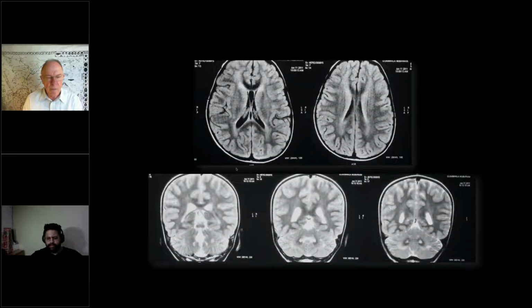So at this stage, I'll probably take over with the MRI findings. And we have the FLAIR images on top. The axial FLAIR images again demonstrate these periventricular hyperintensities with relative sparing of the subcortical regions. And on the coronal T2s in the posterior fossa, again, you can appreciate the similar posterior fossa findings as seen in the case from Dr. Balthazar. Again, there is hyperintensity of the hilus.